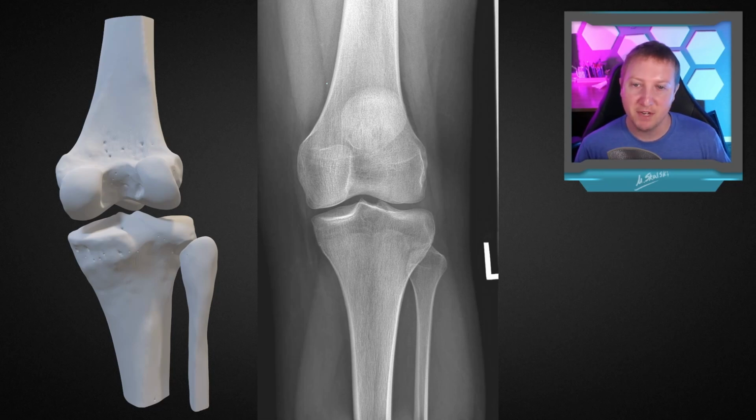And the metaphyseal region flares out like all metaphyses do, and then transitions into the physis. And we often will see a bit of physeal scar, where we have a little bit of remnant calcium where the physis used to be when we were developing, projecting across this way. And the patella, of course, we'll see through the femur, and then this whole area past the physeal scar is the epiphysis. We also see the physeal scar here on the tibia and the fibula as well.